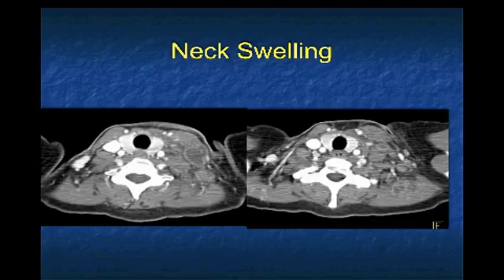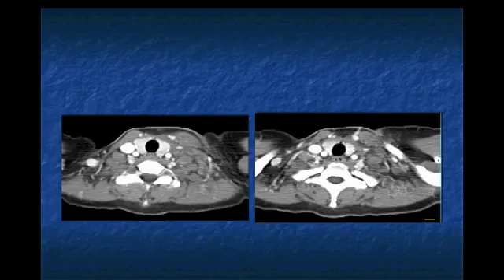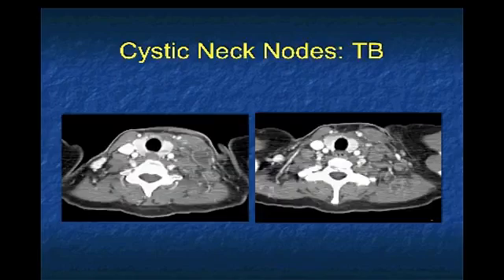Neck swelling. Large cystic nodes, left supraclavicular zone. Again, you always think about lymphoma with left supraclavicular nodes. There's also cystic changes into the muscle. But if I tell you what else could it be besides lymphoma, you'll think hard and then you'll say infection. And then what infection gives you cystic nodes, and that's TB. TB classically can occur in the supraclavicular zone, in the mediastinum, but here it was exclusive in the supraclavicular region, simulating malignancy. Let's not forget about TB.